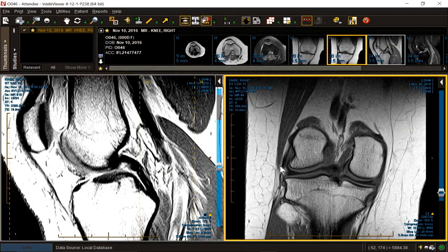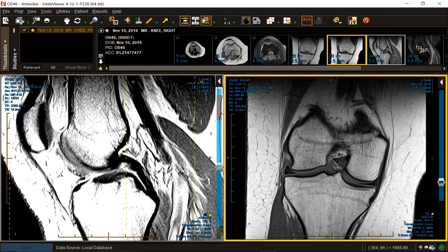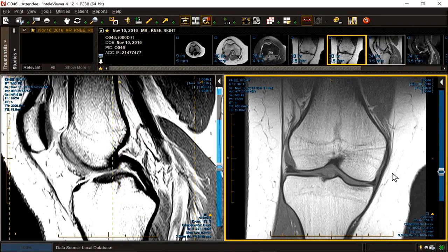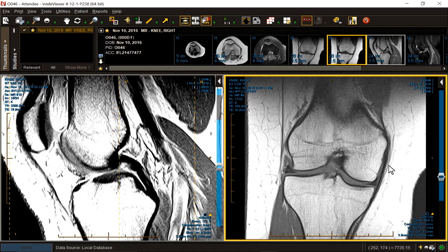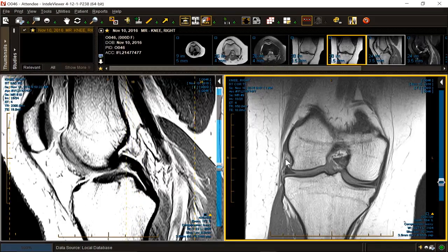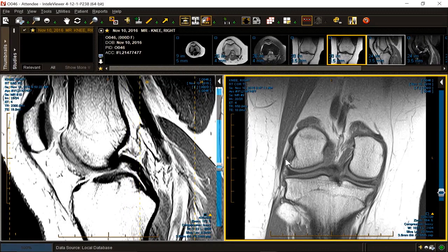We have not taken on the medial collateral ligament. It's a little swollen. I'd use the all-purpose grade here, grade 1 to 2, low grade. Little swelling of the tibial collateral, little swelling superficial to it. Nothing too terrible. I'd probably put it in the body. The lateral side, fine. The posterolateral corner, fine. That's going in the body.